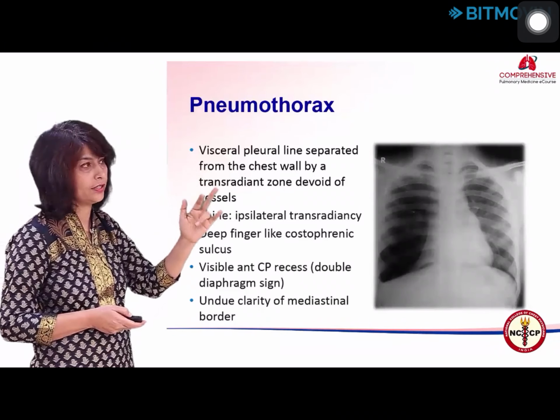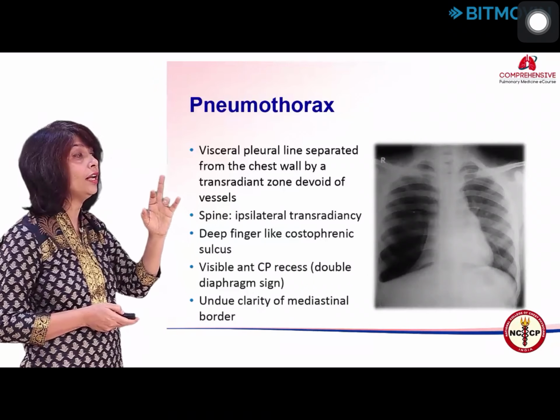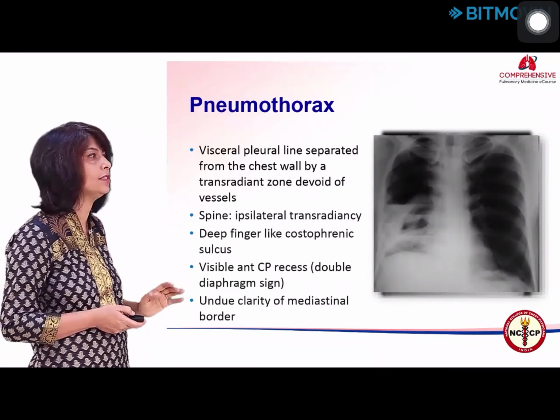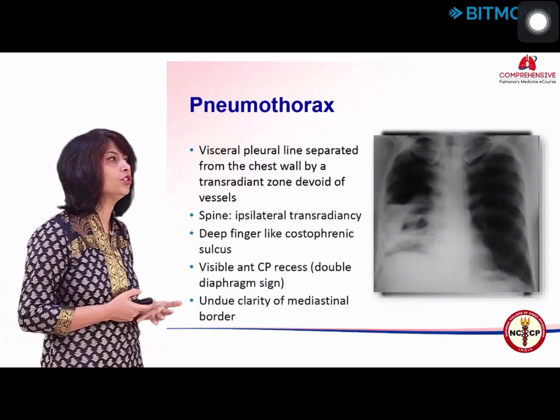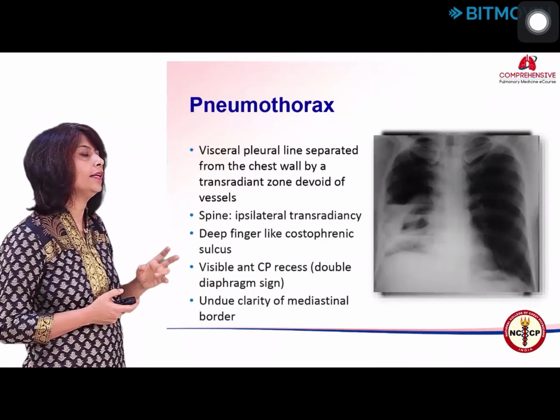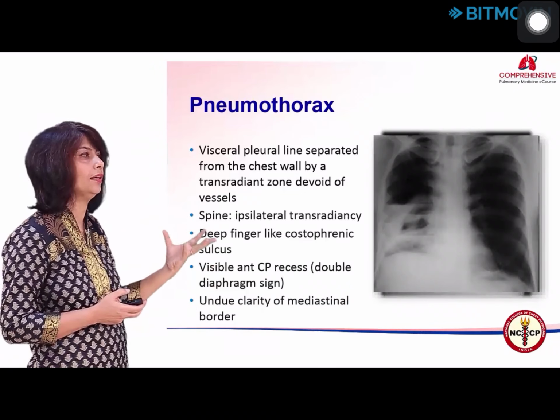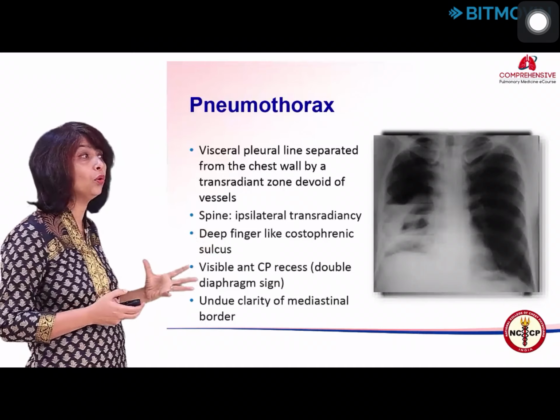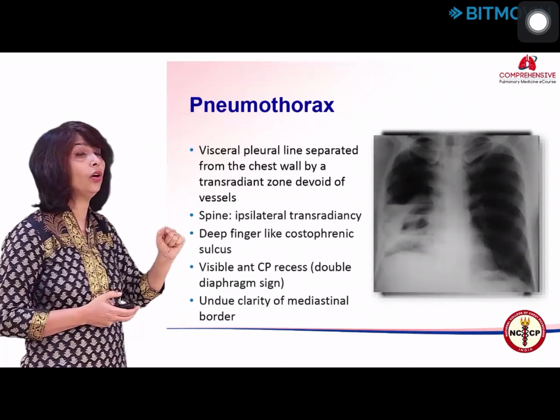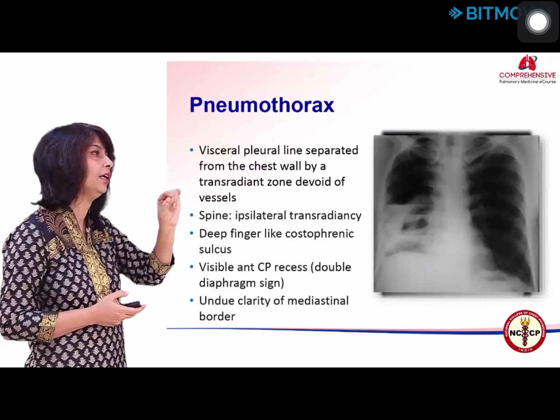When it loculates, especially when it gets multiple air fluid levels, it becomes very difficult to judge whether it's only a loculated pneumothorax or whether it is a lung abscess which has ruptured. So parenchymal versus pleural itself becomes a challenge, and believe me, the challenge remains on a CT scan also. It's not so easy on CT also to say.